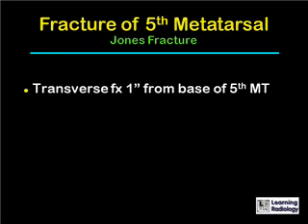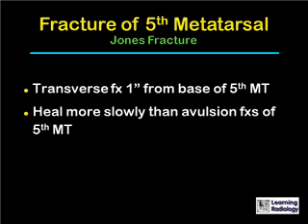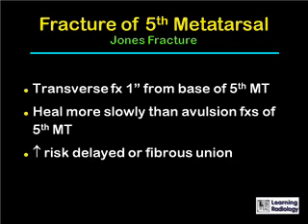A true Jones fracture is a transverse fracture of the base of the fifth metatarsal, which usually occurs about 3/4 to an inch from the base of the fifth metatarsal. Jones fractures tend to heal more slowly than do avulsion fractures of the fifth metatarsal, and there is an increased risk of delayed or fibrous union with Jones fractures.